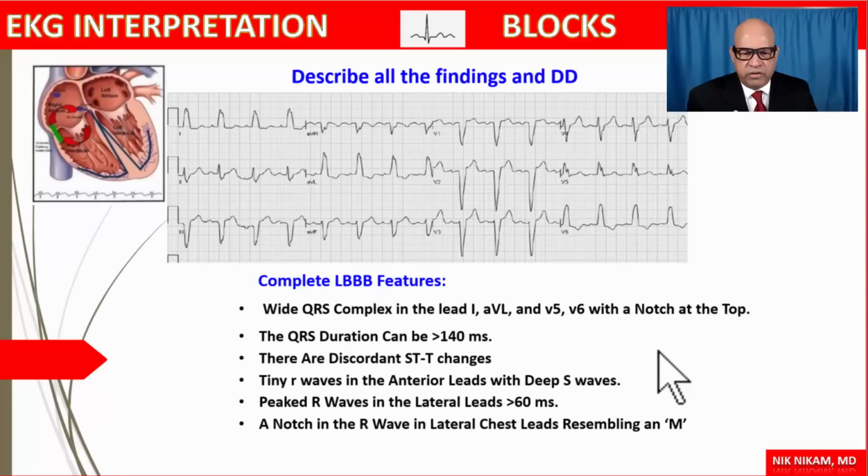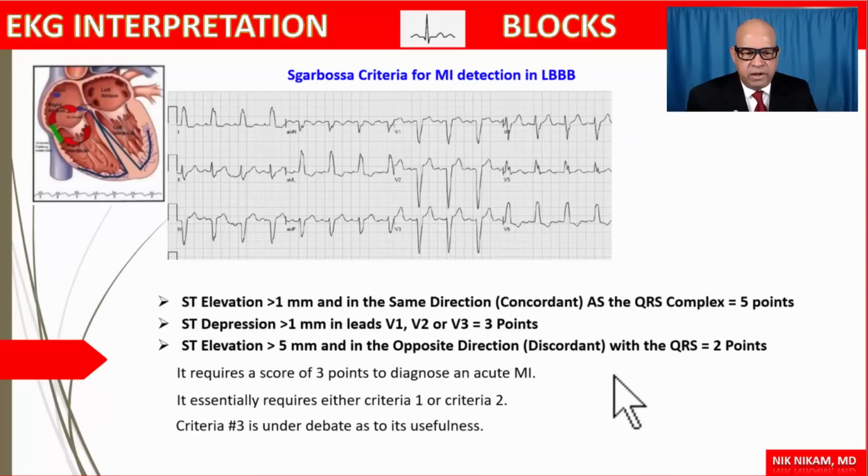Let's move on to the next slide. Okay, here what do we see? Basically, it's the same electrocardiogram from the previous slide, but I am trying to stress another important point. You have heard that we cannot diagnose myocardial infarction in the presence of a left bundle branch block, or if you see a patient with chest pain and a new onset of a left bundle branch block, that is synonymous with acute myocardial infarction, and so on and so on.